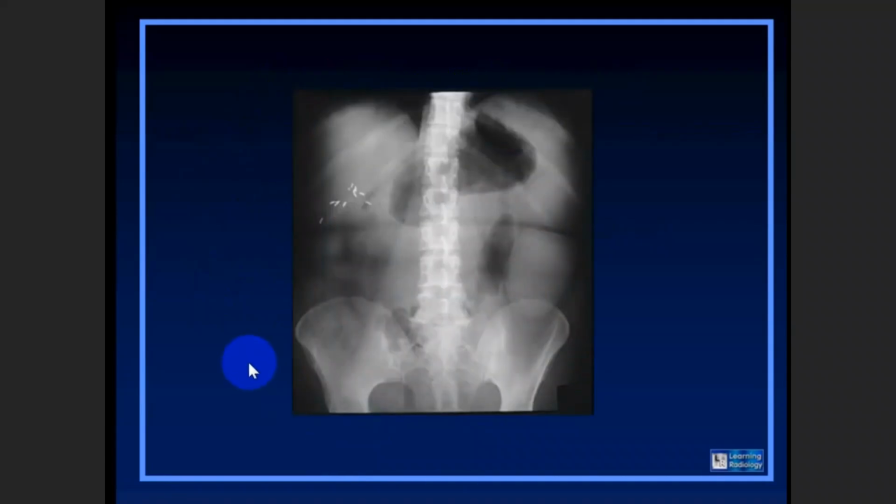Here, for example, we have some surgical stitches at the site of the gallbladder underneath the liver. This is the site of the gallbladder. But if we notice the spleen over here, this is the stomach, and lateral to the stomach we have the spleen. This all is the spleen. So this is a case of splenomegaly on a radiograph.